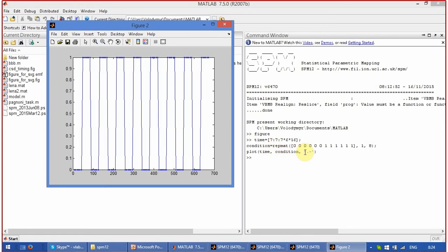Today we will not discuss the syntax of MATLAB and how useful the MATLAB functions are, but I strongly recommend you to keep it in mind.